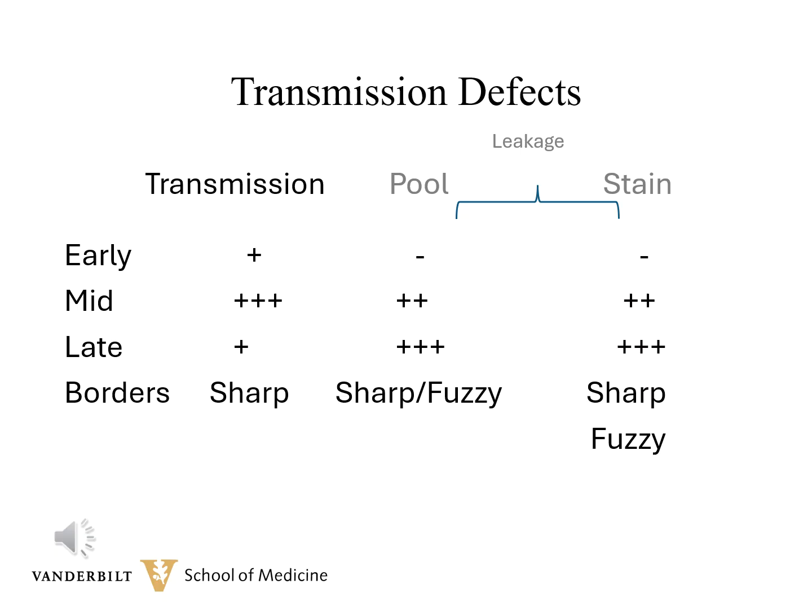With leakage, there's no abnormal hyperfluorescence initially because there are no abnormal levels of fluorescein in the abnormal vessels. As the serum leaks out of its normal area, i.e. the normal retinal vessels, the fluorescence will accumulate, and you'll see the hyperfluorescence gradually get more and more. And this is the case whether the serum, and therefore the fluorescein, pools in a space or stains tissue.